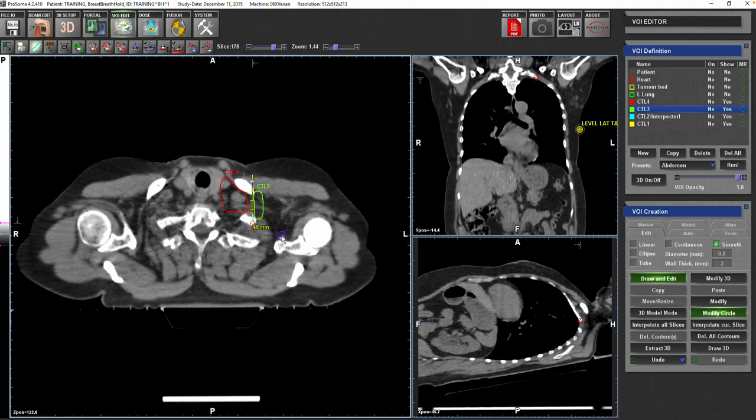And then I don't know where to go. The second landmark, we talked about it last time, was this muscle, which is the pectoralis minor muscle. So all you have to do is to reach the pectoralis muscle, and just at the medial edge of the pectoralis muscle, you draw a line vertically. Then you will see that you don't have anything to do except to join things together, and that will be the start of your level 3.